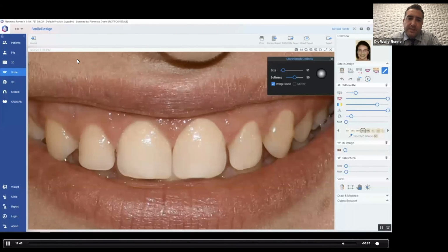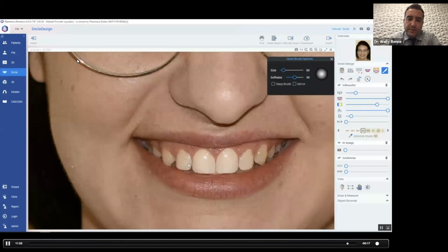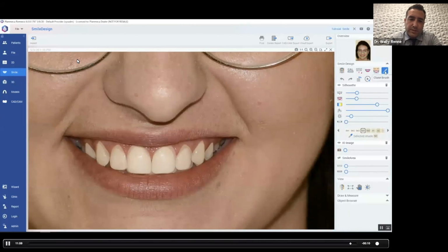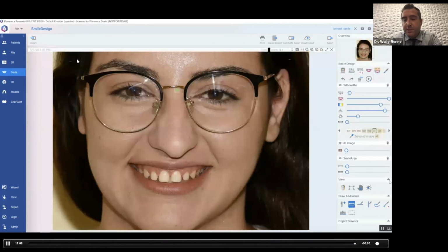And so now I'm just speeding this up so I can show you guys where we're morphing the gingival architecture. We're mirror imaging line angles of contralateral teeth. We're cloning things, and we're zooming out because we're so zoomed in right there. We're at 50 times mag pretty much, way too close. And so now I'm overlaying our silhouette, which had my proper proportions that I wanted the smile to be. And I'm sculpting the teeth to match the proportions. And I'll show you why we do this in a minute. It's because we could get an ultra realistic look at the teeth.